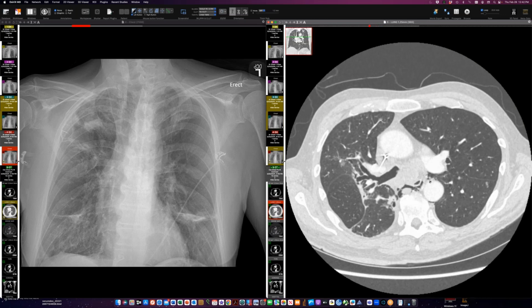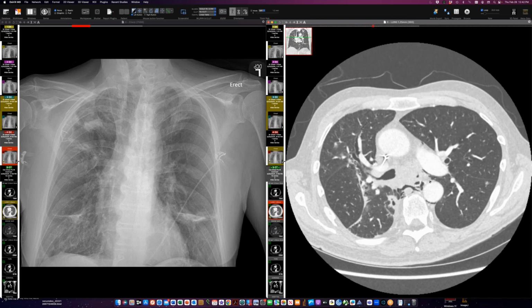So the person, if they'd known that there was this degree of obstruction, wouldn't have gone to intubation on it. So this was part of his metastatic gastric cancer, probably subcarinal lymph nodes. You know, it grew out of subcarinal lymph nodes, invaded the carina, and then grew to this obstructing lesion that took out selectively the left bronchus.